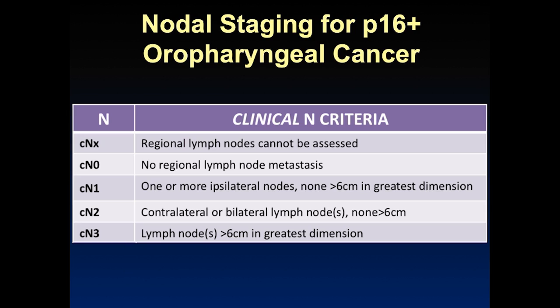disease. So when you're measuring these lymph nodes, if you see a large node and you're trying to decide how to stage it, always measure it in the greatest dimension. If that is in coronal or sagittal measurements, use those measurements rather than just based on your axial imaging, because that's going to change nodal staging criteria and how the patient is treated.